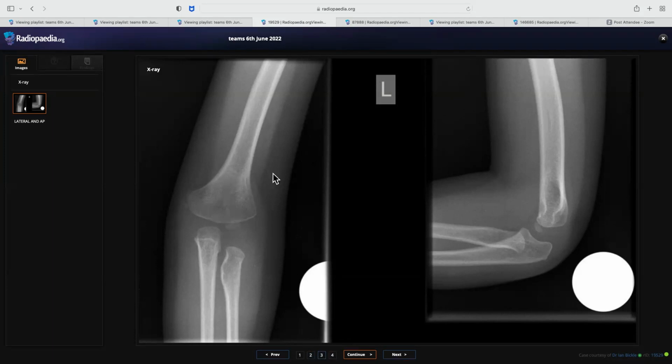So when you see all these findings and suspect Nail-patella syndrome, will you suggest anything to the referrer? Yeah, I would refer this patient to the orthopedic MDT. Yeah, I'm not sure actually. Okay, no problem. We'll go to the next case.